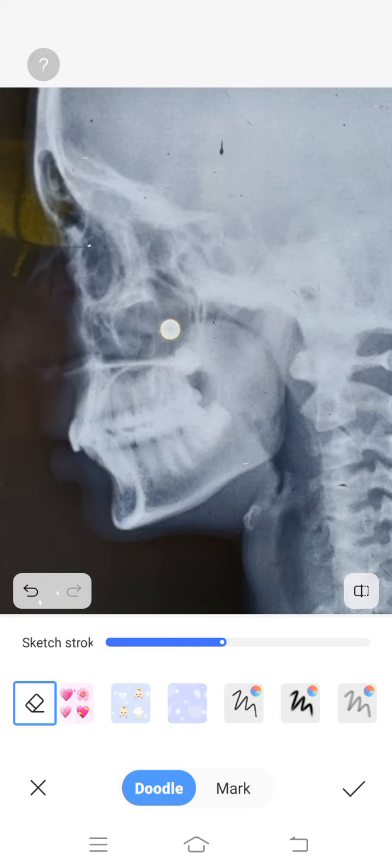This can be confirmed by doing a diagnostic nasal endoscopy, wherein you can see a polypoid mass in the middle meatus extending into the nasopharynx. So the polyp would be pale in color.